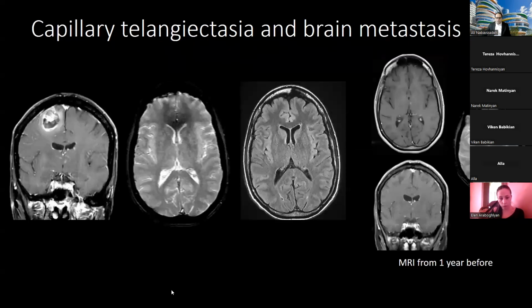And sometimes you have to look at your prior imaging, like this patient that has a brain metastasis in the frontal lobe, and also has a faint enhancing lesion in left medial thalamus that shows some susceptibility on GRE, no abnormal signal on FLAIR. So there is no question that there's a big metastasis here. However, how about this lesion? What should we do with this?